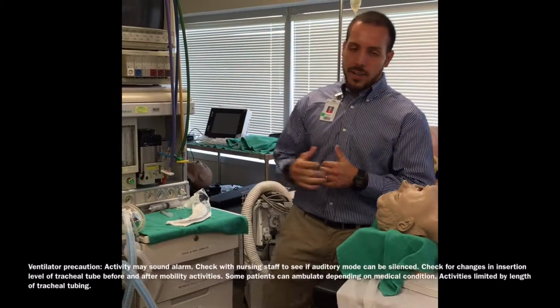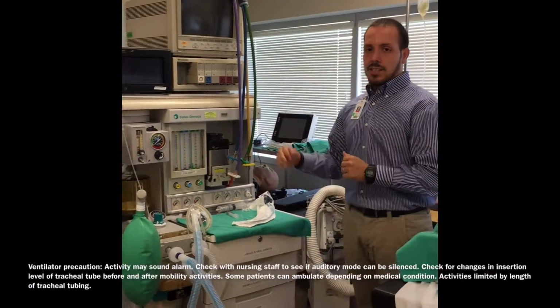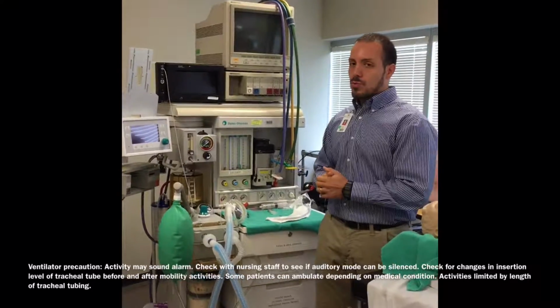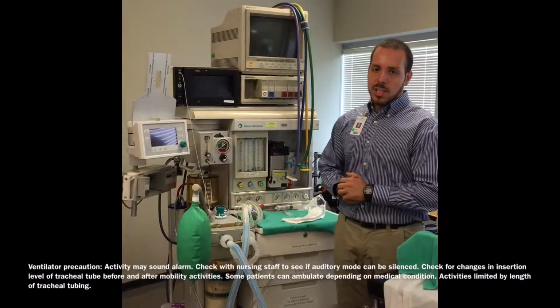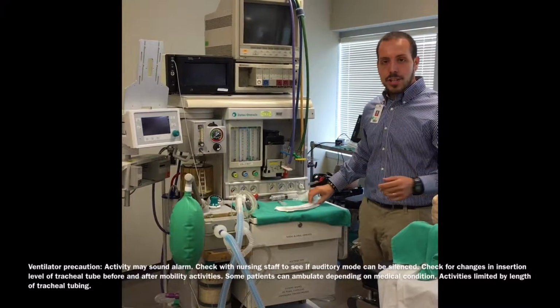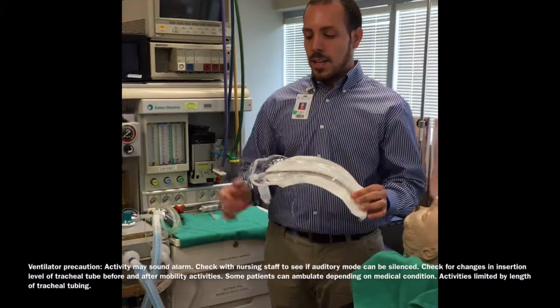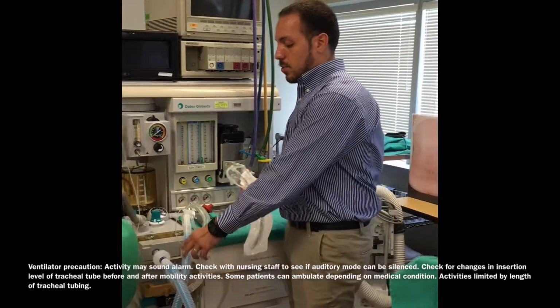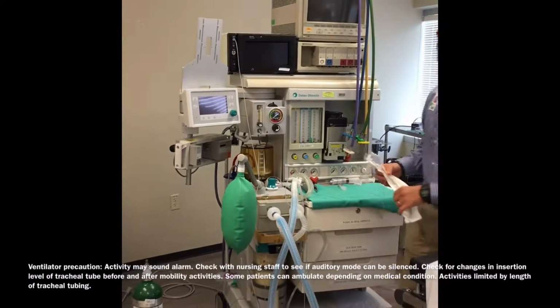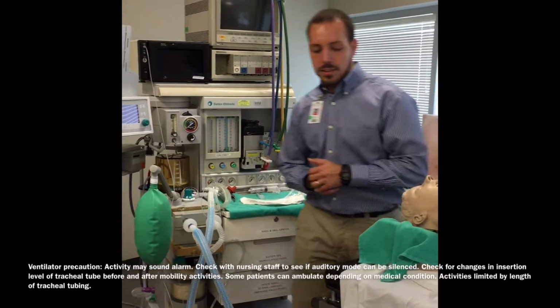So the first device we're going to talk about right here is a ventilator. What you see behind me is the ventilator machine that the anesthesiologist would use. It is used in the OR. In a typical hospital room, it'll be toned down a little bit, but you still would have your patient here intubated with a trach tube, just like we saw earlier. That trach tube would then be connected to our air oxygen tubes, just like you see here. You see that in a typical room.